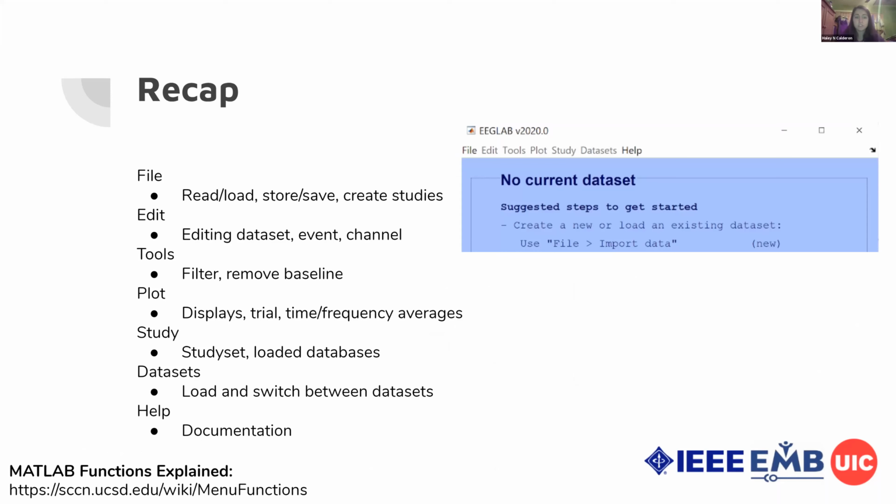For the study one, it's not going to be available to you unless you create a study. I don't quite know what creating a study is, because I have only ever worked with the sample data that comes with EEGLAB, and it doesn't have a study for that. When I do, I will share.